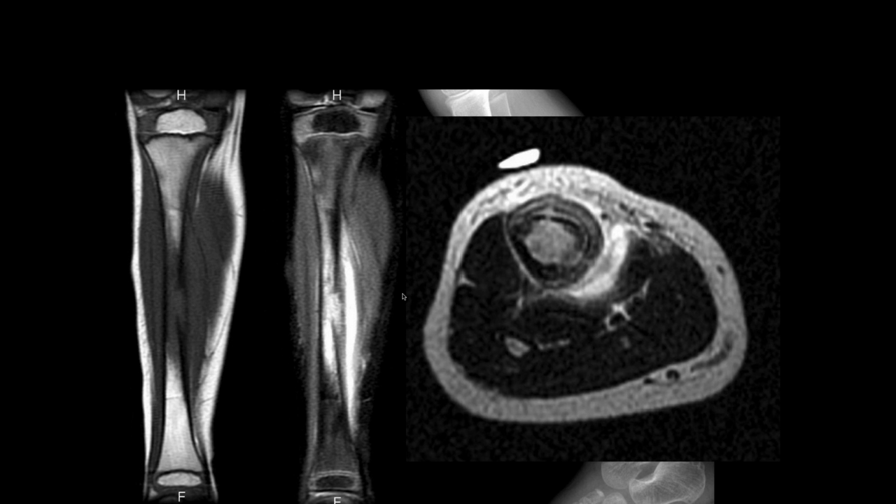So in this area, the tibia is very interesting because there are a couple of things that can happen here that typically occur in younger age groups. So there's a differential diagnosis that you have to consider here. One would be stress fracture. Another one would be osteomyelitis. A third, there are two more.